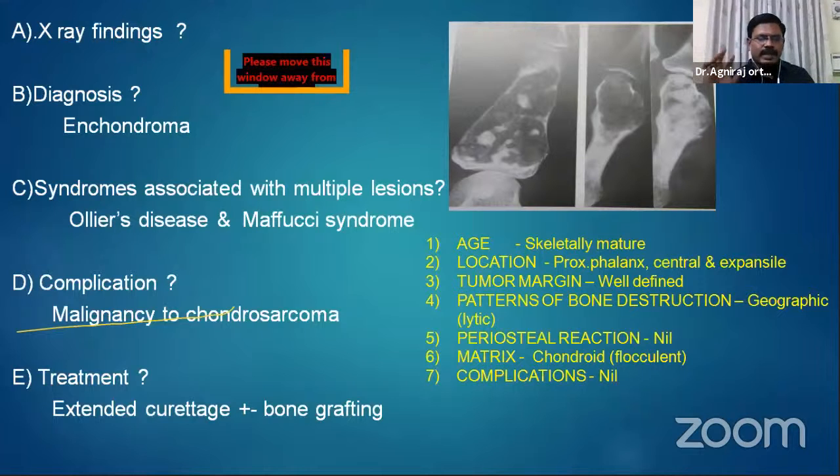Complication nil. Syndromes associated: Ollier's disease and Maffucci. Complications: malignancy and pathological fracture. Treatment: extended curettage plus or minus bone grafting.